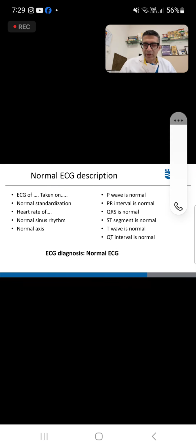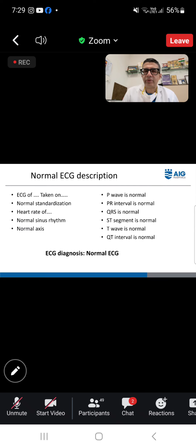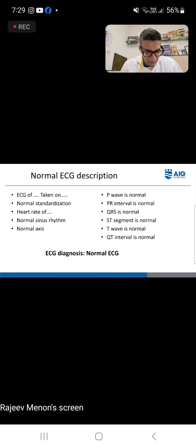Now, after you write this, then you come to the ECG diagnosis. So we said the learning of ECG is one, identification, and the second is the diagnosis. So then you write the ECG diagnosis as normal ECG.